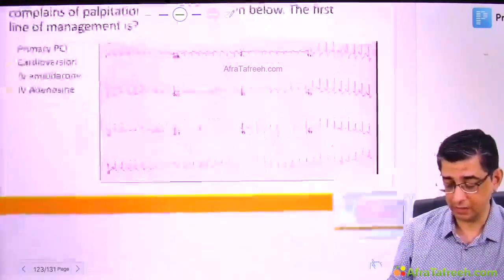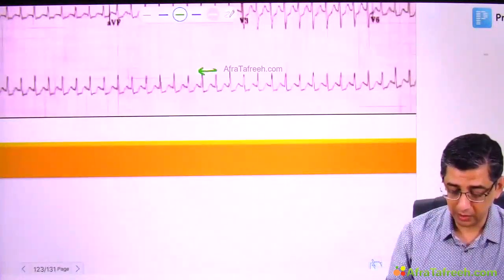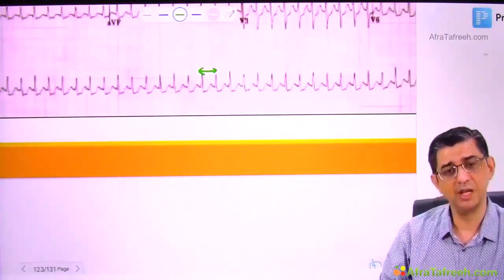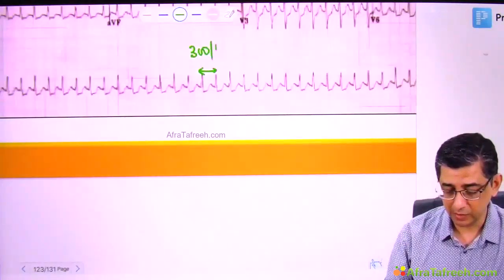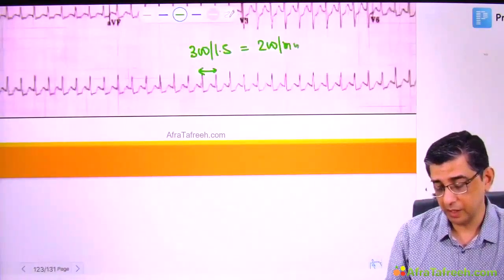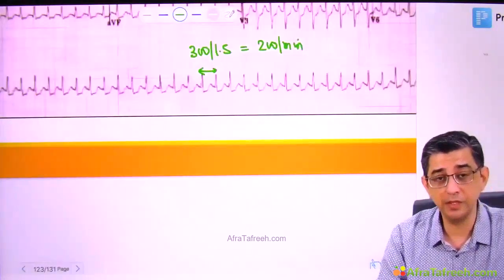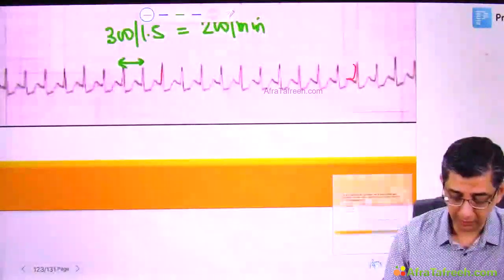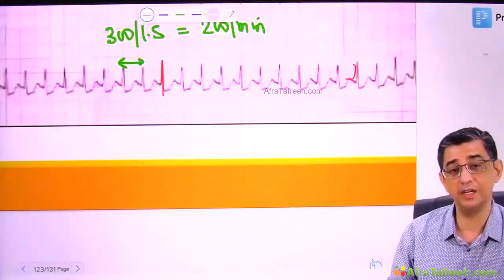Now, if I zoom in into the ECG here, you will notice that the RR interval of this patient is approximately about 1.5 large squares, give and take a few. So average heart rate of this person will turn out to be approximately 200 beats per minute. And then you will also notice that you cannot make out the T and the P wave separately. What you can make out, and I'll zoom in further, is this narrow QRS complex in a sense that R and S are literally jumping on each other.